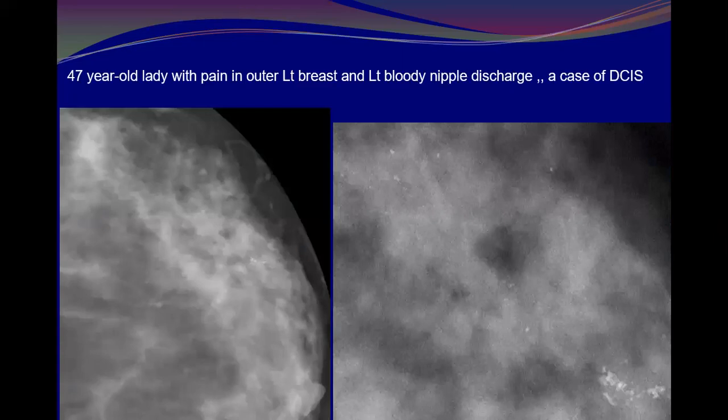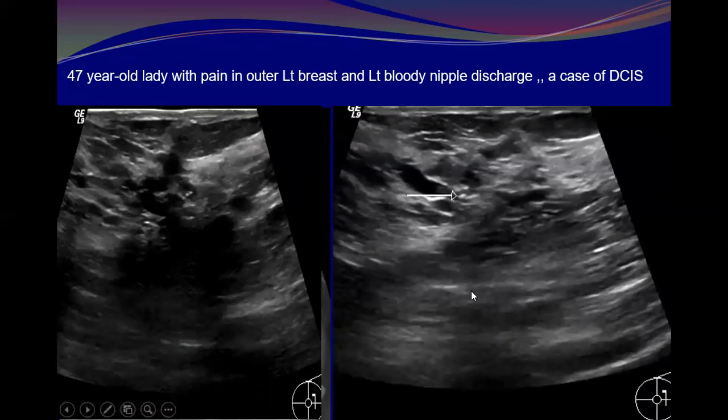This is our patient. Look at this mammography here: a dense breast, and the calcification is barely seen, but well appreciated in this spot magnification view. When we did the ultrasound, look, it demonstrates segmental ductectasia, adding a lot of information to mammography, and soft tissue within the ducts. We could even appreciate the calcifications in this case of DCIS with a good machine and good image optimization.